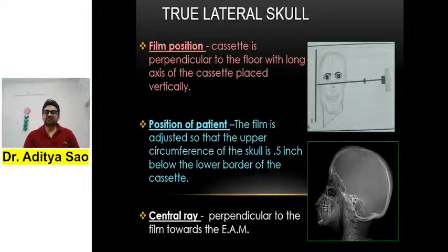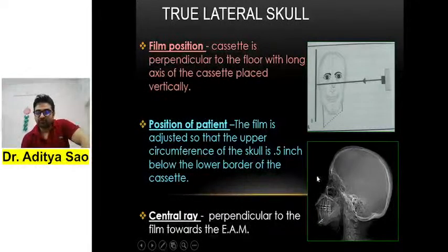True lateral skull, this is a true lateral skull. As I said, there is no soft tissue profile and the vertex can be properly seen. Clear?